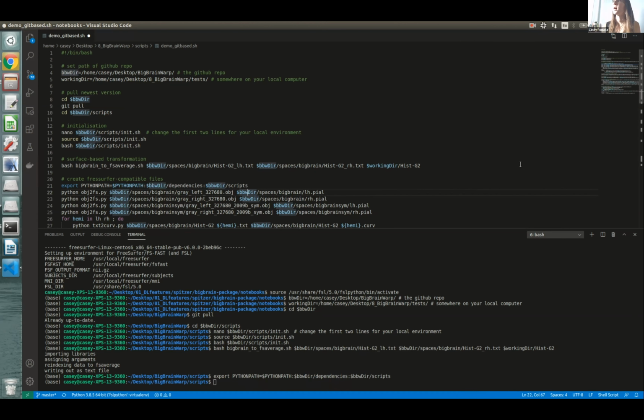Right. So for the approach in structural imaging, Konrad will talk a lot more about construction of equivolumetric surfaces later, I believe, but as a brief overview, you essentially take your pial surface and your white matter surface from, for example, FreeSurfer, and then you construct these equivolumetric surfaces between them. So it's a set of surfaces within the cortical mantle. And then you can use different commands. I'll go through one in a moment called volume_object_evaluate, for example, which is a MINC command where you sample the intensities along that surface from a volume.